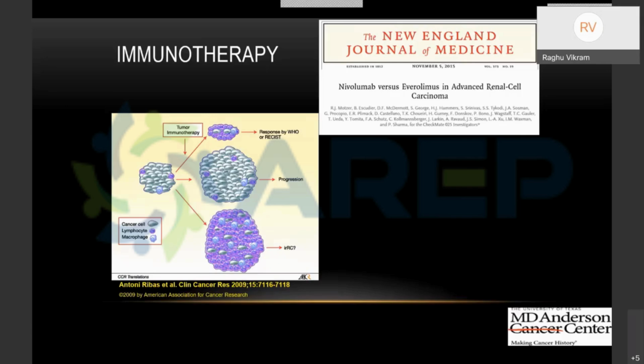I am more of a believer in, I mean, it depends on how confident you are that this is not enhancing, right? A lot of the times when you look at a nephrographic or an excretory phase, you can see that it is not enhancing, even if you don't measure it, I generally ignore it.